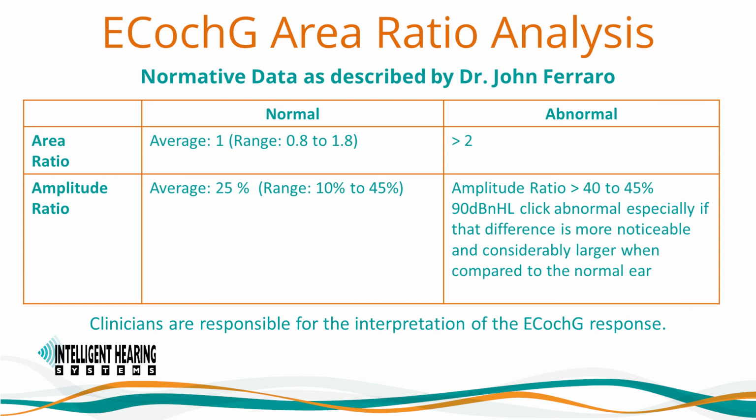Ultimately, clinicians are responsible for the interpretation of the eCoG responses. Please note, the purpose of this video is to demonstrate software operation of the SmartEP eCoG modality. For clinical guidance, please refer to the literature and other professional resources.